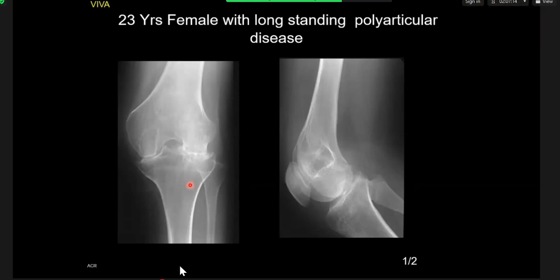So that was a catch, and it has happened. Please remember, I'm showing it to you for a particular purpose. This is a classical, very favorite film where they will show you some young patient, particularly on knees. And this also is what we call a story film. Story films are extremely important for your 2B exam. A story film is a film which tells you a story, simple as that.